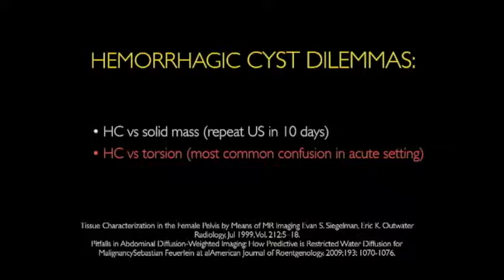So another kind of dilemma with hemorrhagic cyst, as we talked about, is whether it is a solid mass or truly a hemorrhagic cyst. If you're uncomfortable, you could follow up. You don't have to wait for 4 to 8 weeks. You could really do a follow-up in 3 days, 10 days, and if you see change within it, you're reassured that this is a benign process.